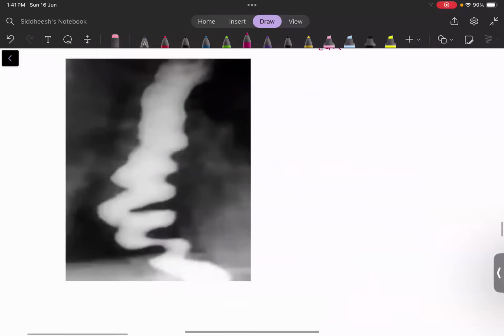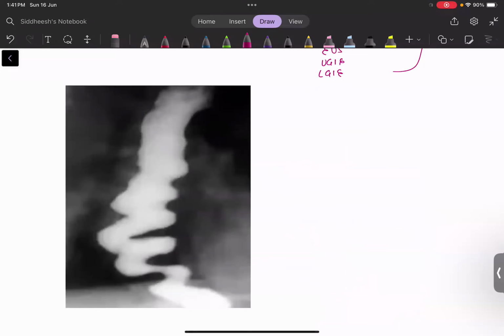Okay. So let's discuss one more image now. Again, this is the esophagus that we are dealing with here. Now, remember in radiology we have certain unique names. We have bullseye, corkscrew sign, river flow sign, sandwich sign, snowman sign. All these things come up.